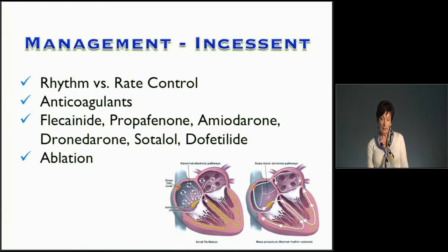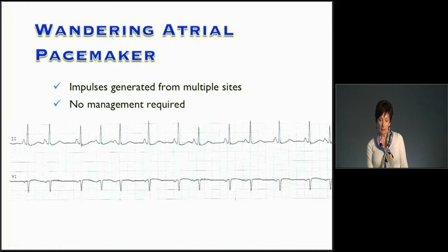Now, the last thing that we'll talk about, I think, is wandering atrial pacemaker. Wandering atrial pacemaker is not anything that we get worried about. We don't treat it. No management is required. It's where, again, there are more than one site in the atria that develops the property of automaticity, but it fires at reasonable heart rates.